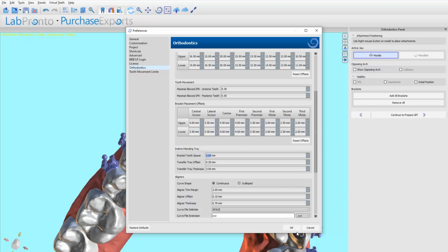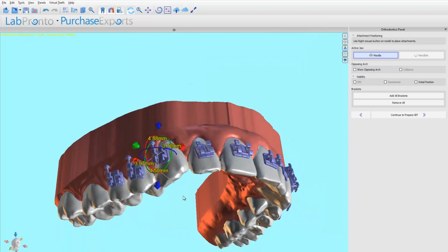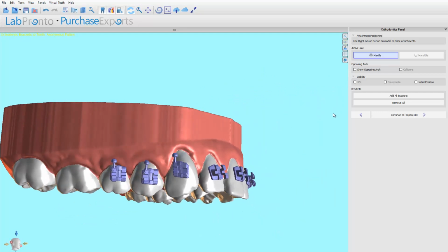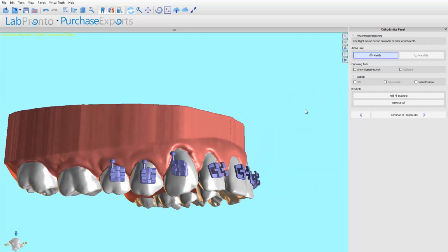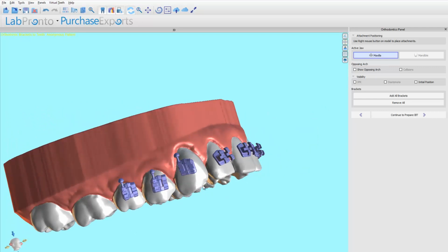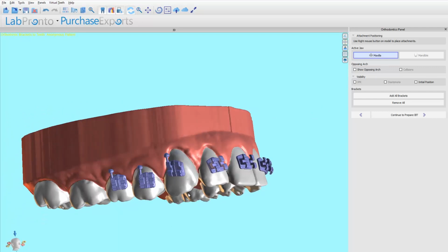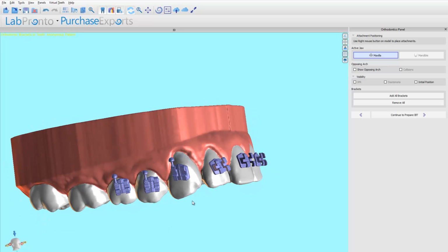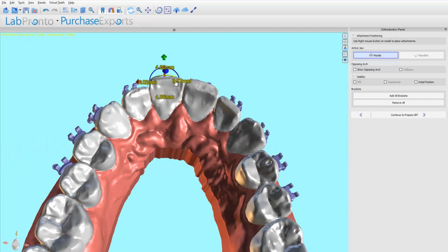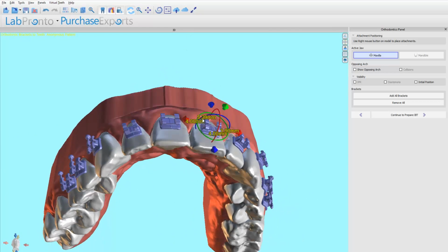And I'm going to leave the bracket tooth spacer. Fortunately, that doesn't change anything about my brackets. Those are all fine, okay, because that didn't affect anything that I was changing there. What it does affect, this canine is really odd the more I stare at it, because you can see how much wear there is. You know, her cusp tip should be right around here. So positioning the bracket is a little bit different because she got some fairly significant wear. I mean, you can see it everywhere else.